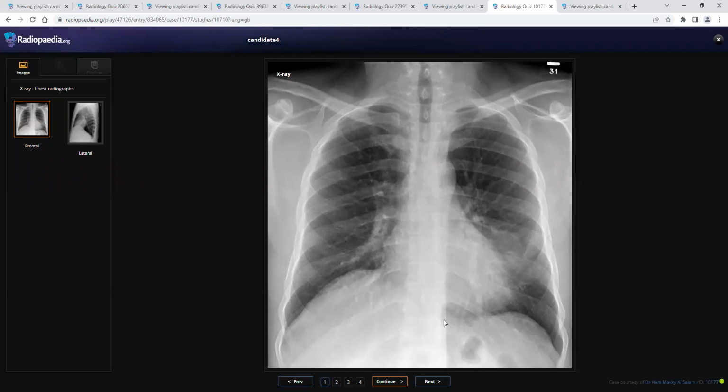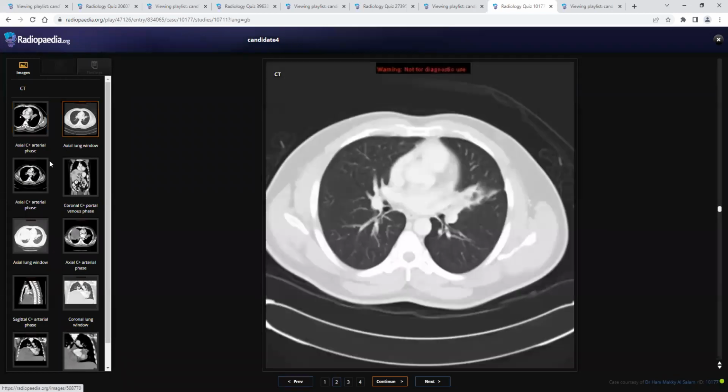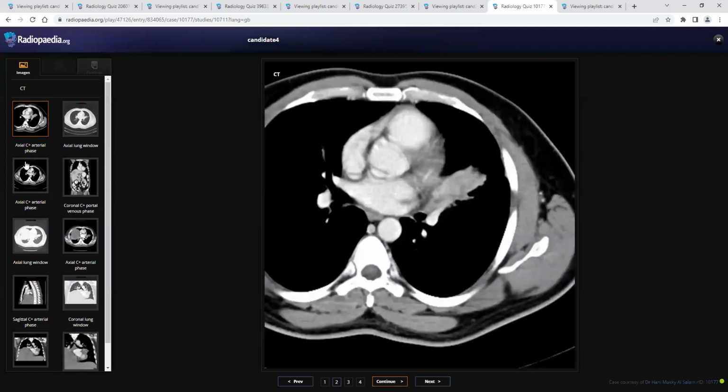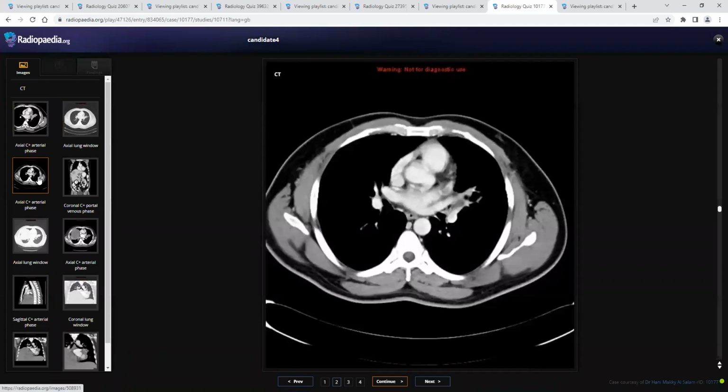As you requested, we did a CT. These are the series of images you can take. Select from the series there from the left side. These are static images focusing on the abnormality. Okay. I can see there is a collapse or atelectatic consolidation in the left upper lobe. And no evidence of any air bronchogram in that.